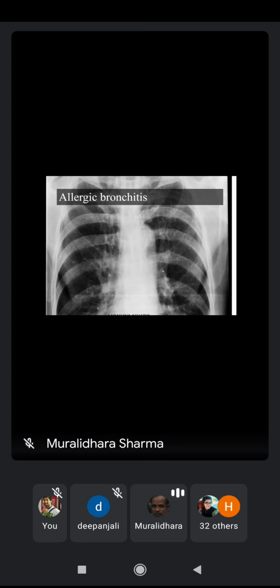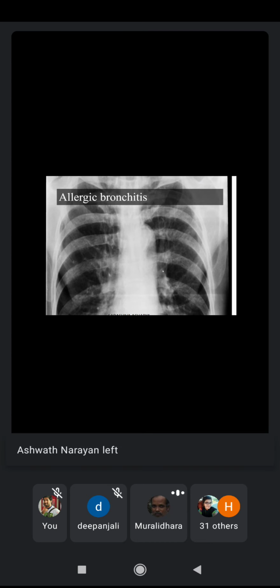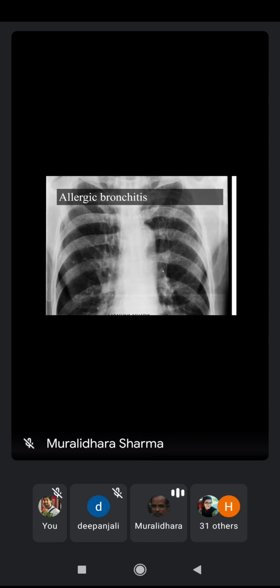We will come to that later. But early stages of exposure to pollution or any pollutants, I am not saying only silicosis, can result in a similar appearance. Often it also has a similarity to interstitial lung disorder. I will come to that interstitial lung disorder immediately next. Let me show you some examples.